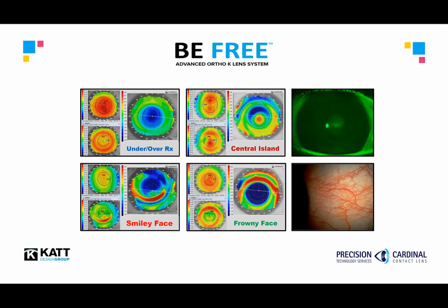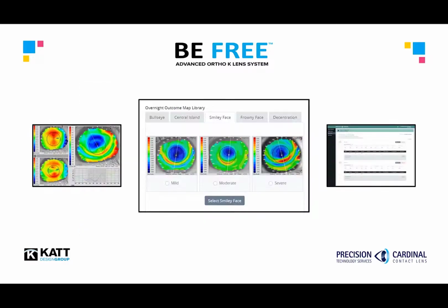The variety of responses to orthokeratology can be fairly broad. Knowing what to modify when the lens undercorrects, or rides high, or produces staining can be a challenge, especially for the neophyte orthokeratologist. The BE FREE software was designed to simplify the entire process of analysis, lens modification, and processing.